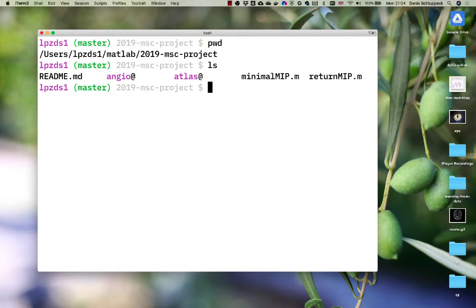Okay, so I set you a little challenge to superimpose those images that we have. So have a T2 weighted image underneath, which is a very good anatomical image, and then superimposed on that, you could look at one of those magnetic resonance angiography images, the MRAs, which are also kind of anatomical images, and they have this very special property that blood vessels, arteries, are very bright in them.